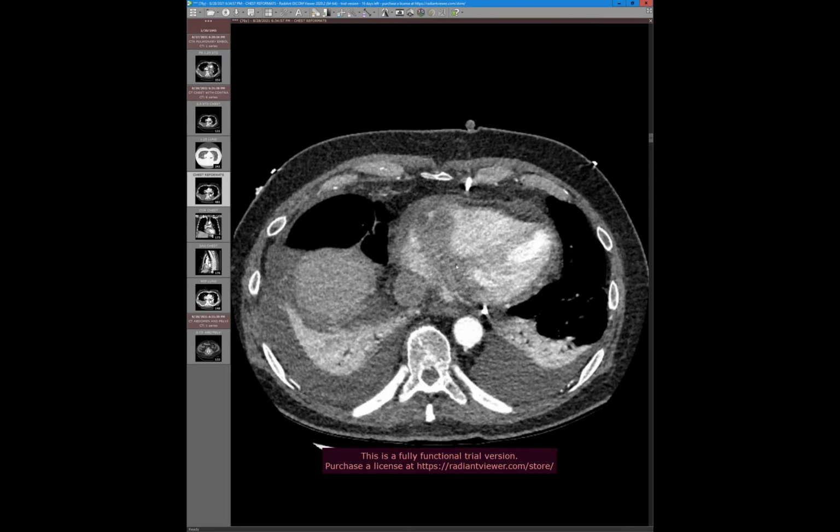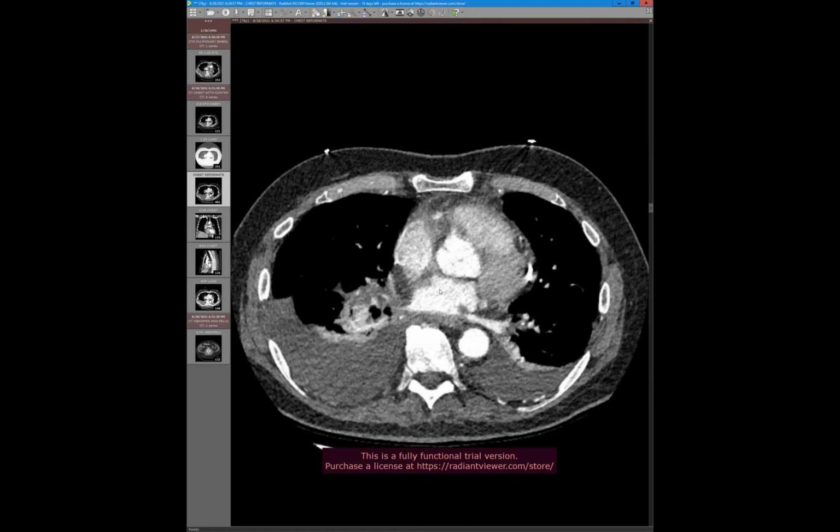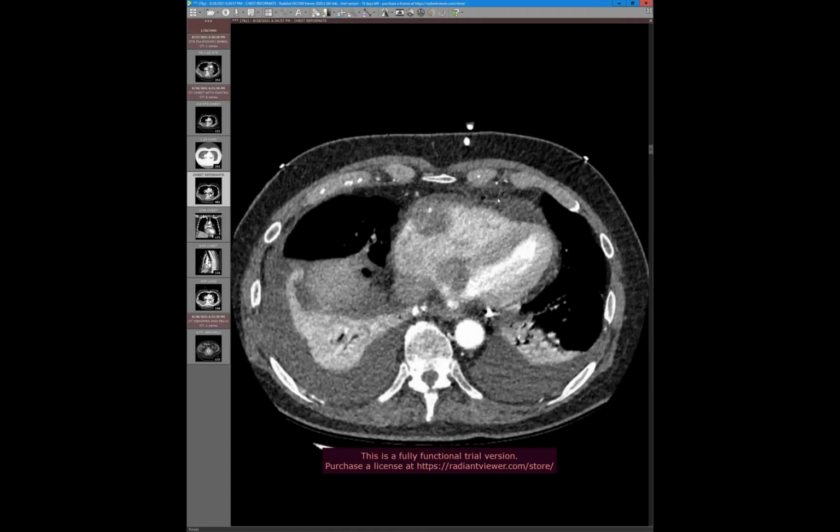But also the infiltrate, it's going along the septum here. This infiltrative pattern is also quite atypical for angiosarcoma, which just turns out to be a big mass, usually extending anterior.